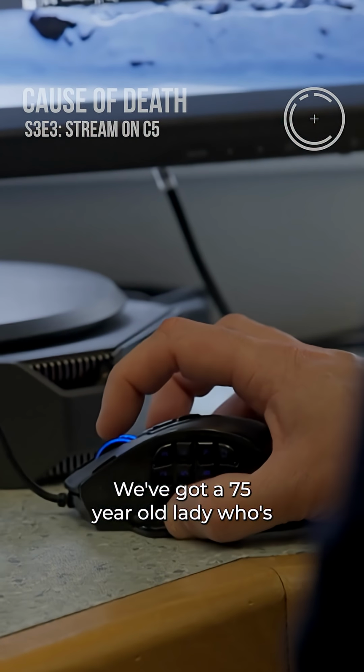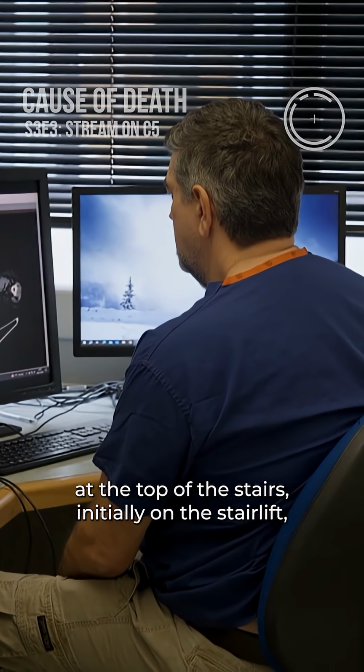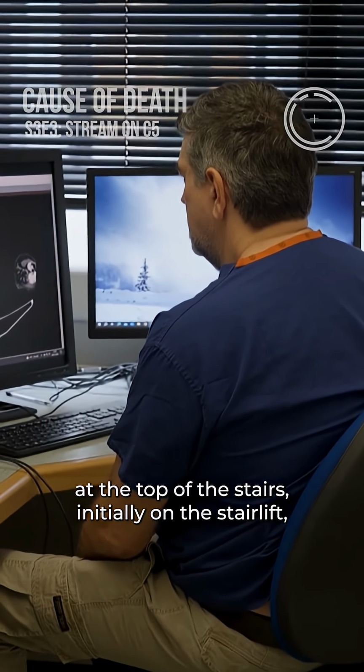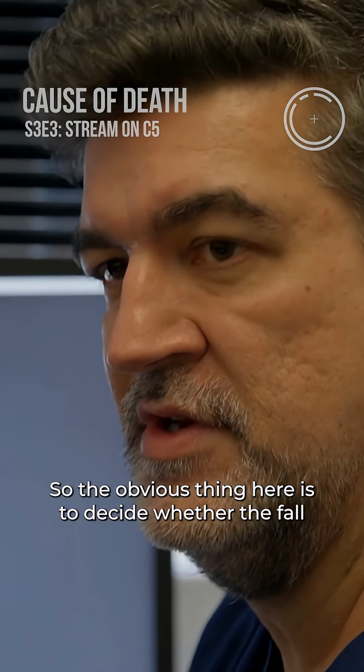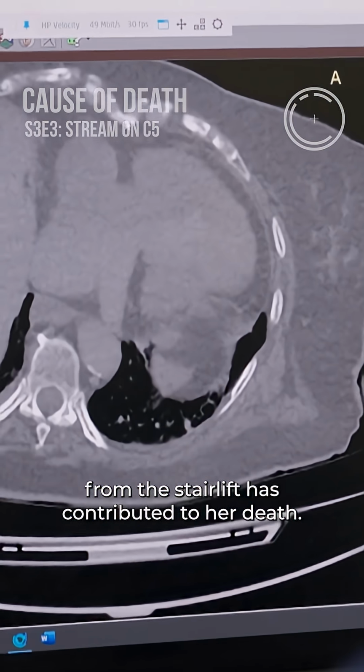Got a 75-year-old lady who's at some point fallen off a stair lift, having been found at the top of the stairs initially on the stair lift, unresponsive. So the obvious thing here is to decide whether the fall from the stair lift has contributed to her death.